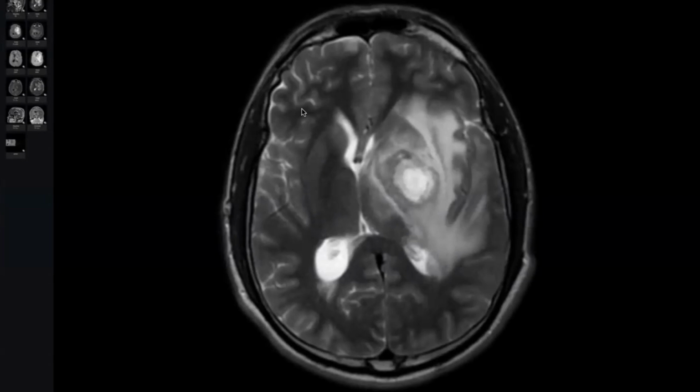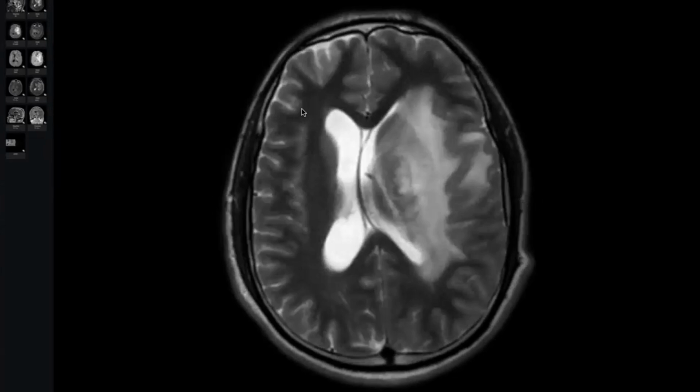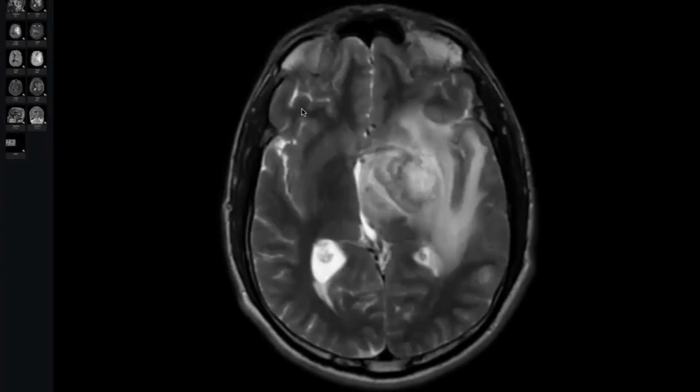When you tell the examiner this is vasogenic, you cut a very long way for you and for the examiner. So you are not running in the pathway of infarction. This is very important. So almost you are running in another way. What is this other way? So this is vasogenic edema with resultant mass effect and subfalcine herniation.